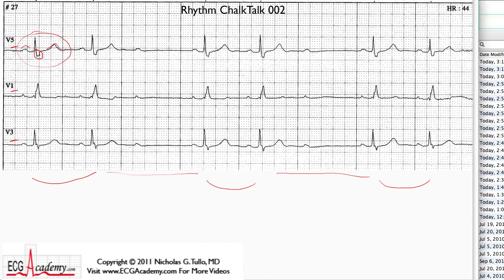If you measure the entire QRS complex, it's only about 110 milliseconds. So this wide S wave and this RSR prime in V1 suggests that there is an incomplete right bundle branch block going on, but that's something for a 12 lead to confirm. Anyway, the PR interval of this beat is about 200 milliseconds. It's at the upper limit of normal, right about 1 big box.